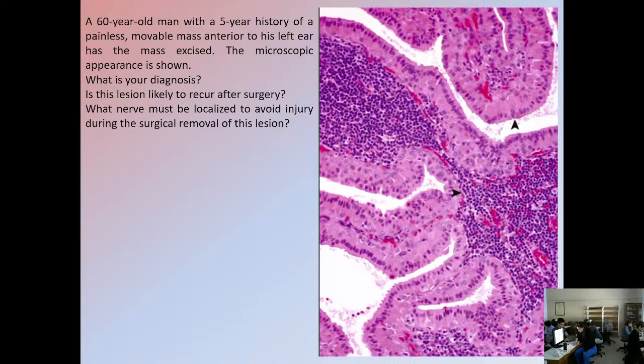These are called oncocytes. Do you remember what other kind of neoplastic cells, when well differentiated, has pink cytoplasm? It's a marker of differentiation. We've seen such a neoplasm. Yes? Squamous cells, yes.